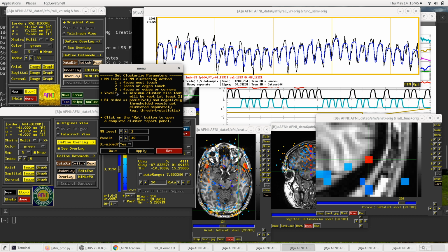And then if you allow the 8 corners of that large 3 by 3 by 3 collection of voxels to be connecting, then you'll get 8 more voxels in there. So you'll get 6 or 18 or 26 neighbors in these 3 cases. And of course there's one central voxel, which would give you 27 in that 3 by 3 by 3 grid. So that's the NN level.